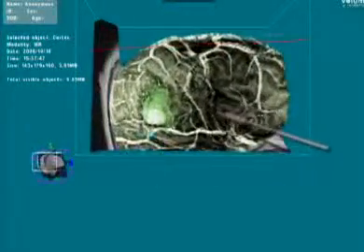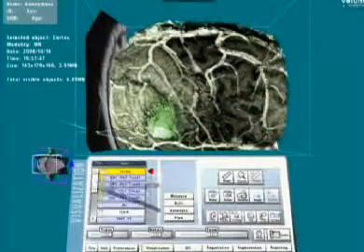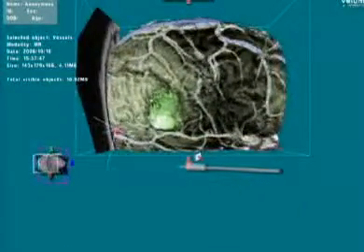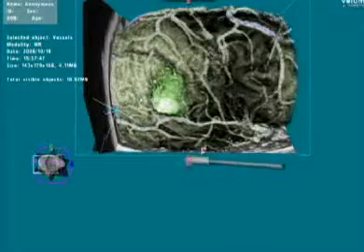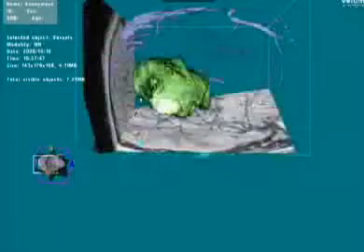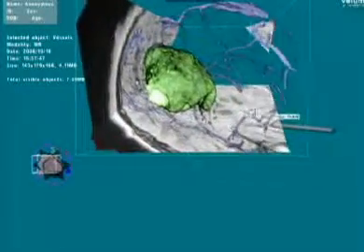And you can see the location of this lesion, and here you can get an impression of where the post-central gyri are, in 3 dimensions from the surface, as well as where it lines up in surface anatomy vis-a-vis the pli de passage in the motor cortex, as well as that central strip. Again, this type of imaging gives you a very good representation, and as you saw in Dr. Buchholz's presentation, very nice 3D imaging of venous structures, which are important to determine when you're approaching these types of lesions.